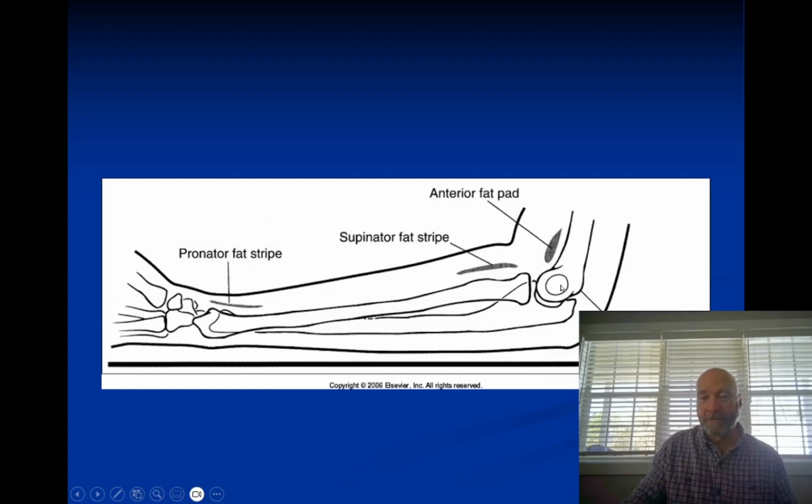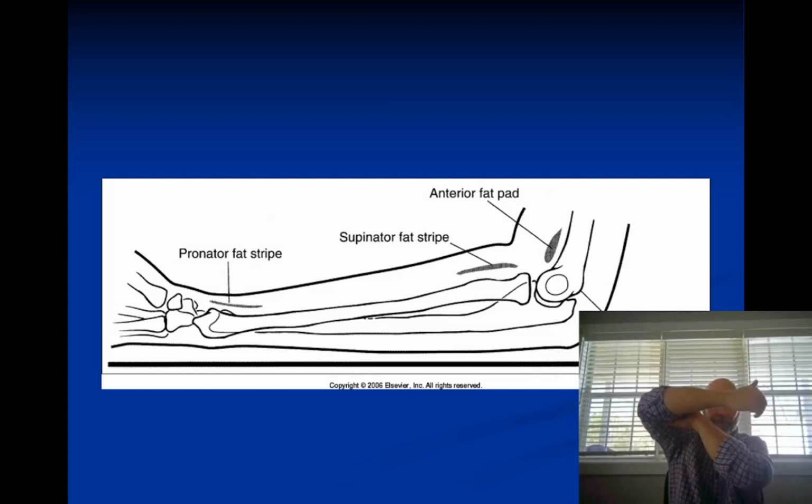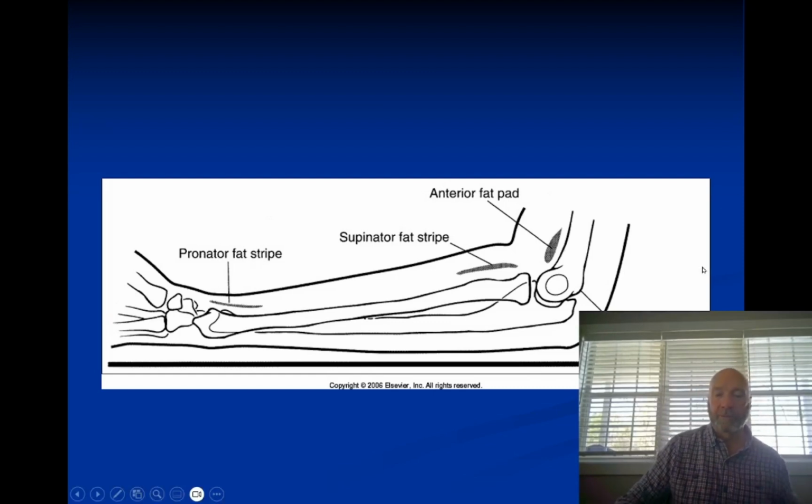In this case, since this is the radial head, this would be the capitulum. And so what we've got then is a situation where the radial head and the capitulum is distal. So again, they position the patient like that. No, it's proximal. So we've got the patient position with the shoulder depressed.